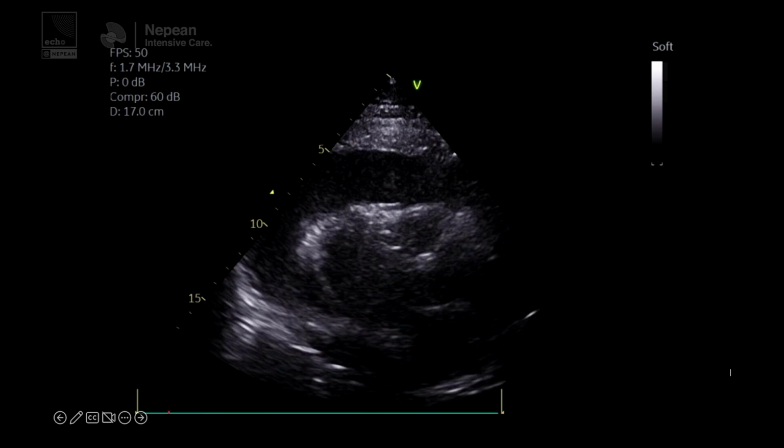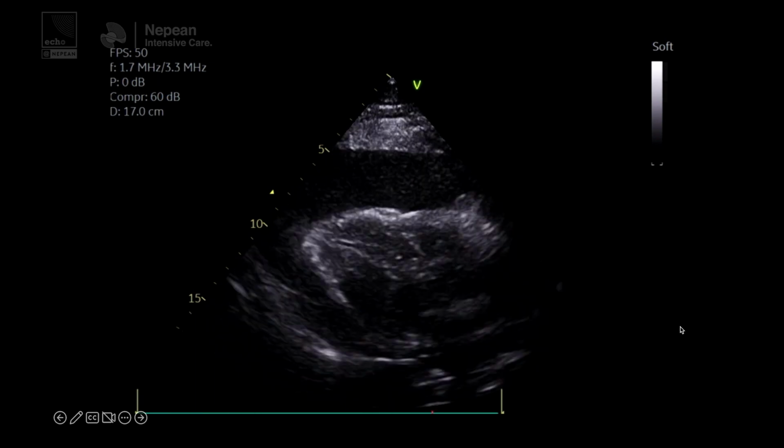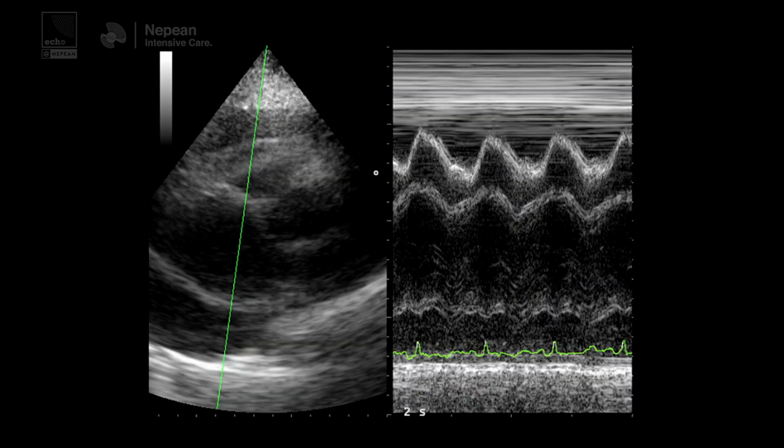here and I haven't put on the ECG tracing, sonographers would snap out. So this is an example of another one where you've got side by side imaging of M modes, and you can see that during diastole you've got collapse of that right ventricular wall. And so this is quite a nice way of demonstrating that clearly.